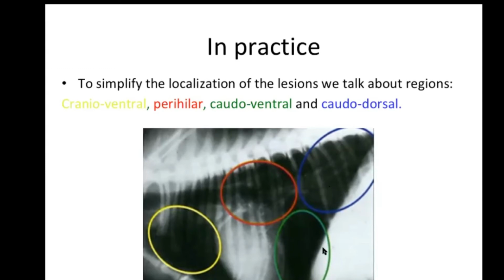So this place here. So when we describe a lesion, I repeat, we have to say where is it, because it's not going to be in all of the lungs. Sometimes it's going to be in 1 or 2 parts of the lungs, and we should know that. In order to know the abnormality, it's very important to say where is it. Where is the lesion? The location of the lesion. And we have to know this by heart. Because if I ask you to describe an x-ray and you say just one word, it's going to be all wrong.